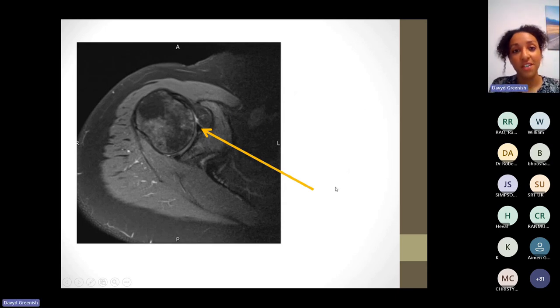Slightly different structure, but again, we're not going to panic. We've orientated ourselves to the shoulder with the humeral head. We've got the glenoid here. What structure might be triangular and black on the glenoid? Any suggestions?